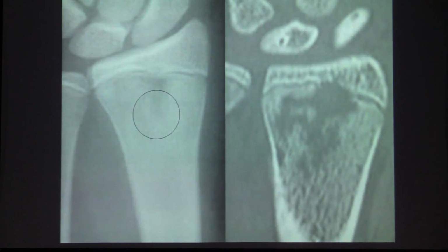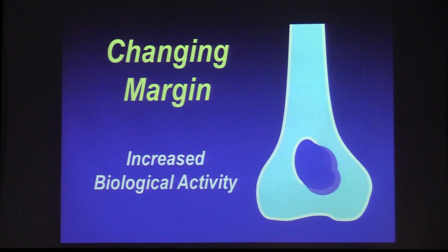This was an orthopedic surgeon's son who had some pain in his wrist. His father put him in a cast, and it didn't go away in 2 weeks, and brought him in and had this lesion there. And you can very nicely see that ill-defined pattern of osteolysis with a few sequestra as well, and a little single lamella of periosteal new bone formation on the CT in this patient with osteomyelitis of the metaphysis of the distal radius.